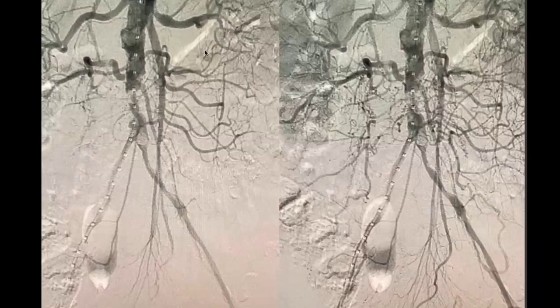Tell me what this is. What is this? And you see one on the other side. What artery is this? It seems to be the colic, left colic artery with branches towards the left side. This is coming directly off the aorta? Yeah, lumbar artery. Oh, no.